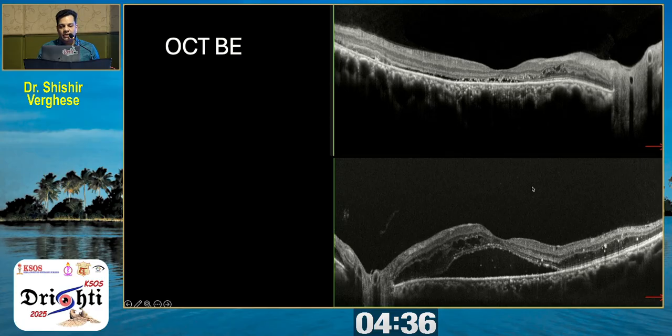But when you do the OCT, you see this picture in the right eye, which looks like this long subretinal fluid along with precipitates in the subretinal space. This whitish color, what you see as subretinal precipitates, along with a large amount of shallow fluid. This is in the right eye, and in the left eye, you see this like a DME fluid, but along with that, a large amount of subretinal fluid. So this did not look CSME or a DME to me.